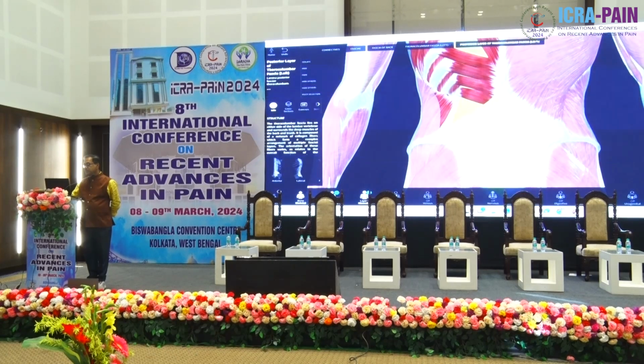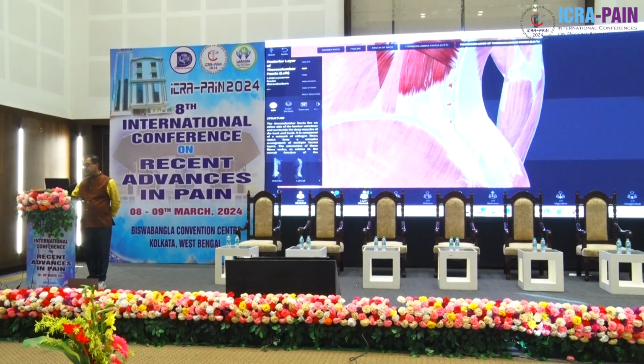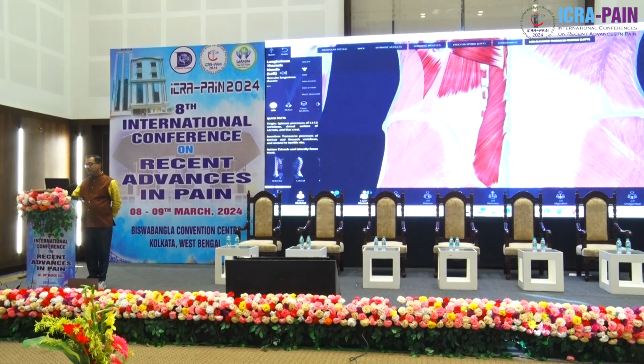This is your thoracolumbar fascia. Let me remove that also. Then here in the lumbar area, we are getting the erector spinae group of muscles. So, what is this muscle? Medial, multifidus, but multifidus is deep. So this is longissimus. Okay? So I am removing the longissimus.